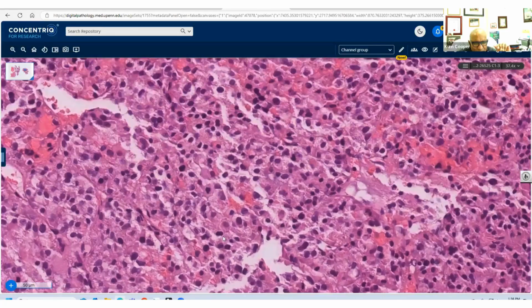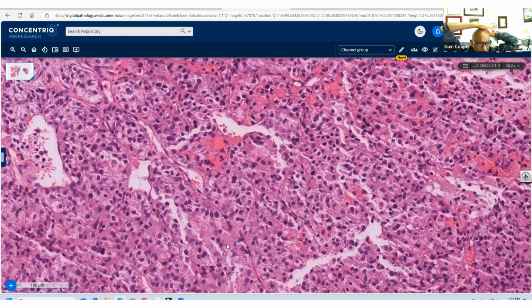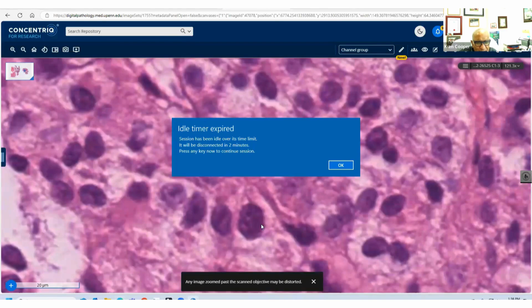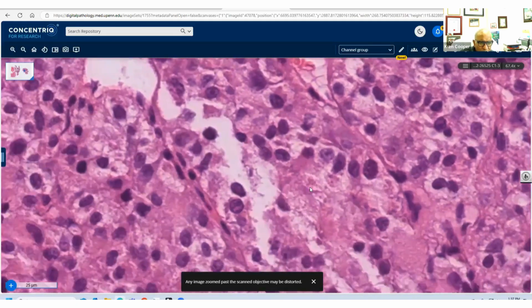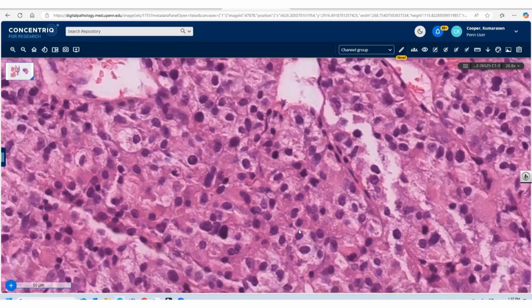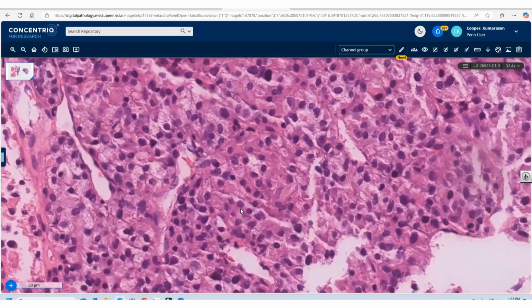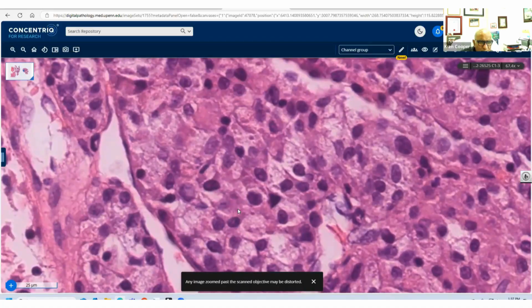Okay. Any other thoughts, anybody? Maria's given us a good headway into this tumor, right? So pink cells, some of them looking a little granular. The nested pattern she mentioned, and nuclei large, some of them having nucleoli. You can see a nucleolus here, the eye of faith. It either doesn't scan well or there are nucleoli, so you have to believe me, there are nucleoli here. So, alveolar soft part sarcoma and PEComa. Why did I know you were going to give me that differential, Ahmed? Any other thoughts, anybody, before we talk about Ahmed's suggestions?